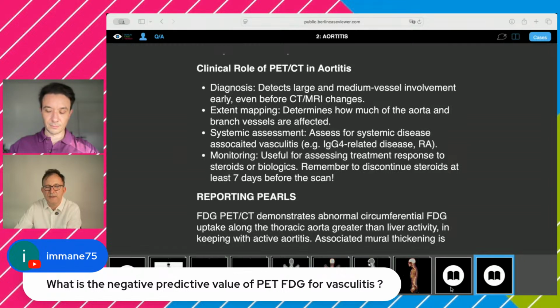We had recently in our hospital a case. There was diffuse but intense signal coming from the muscles of the arm, of the forearm, and of the thigh. And in the report, it was mentioned this is increased muscle tonus. Can you say something about muscle tonus and how to avoid it and how to cope with it?